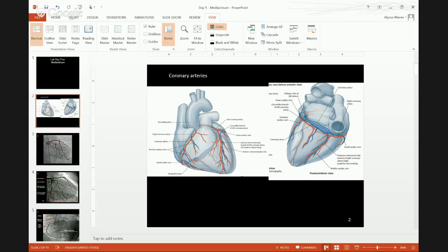So 2, we see the aorta, remember that comes off of the middle of the heart. So in 3, where we don't really see any aorta or any other vessels anymore, we're starting to see some sternal stuff here. We know that this is pretty anterior in the heart. Also, if you notice, the space of the ribs is getting smaller. So we're coming more anterior. Over here, the space in the ribs is quite large as we're moving forward. The space outlined by the ribs is getting smaller and smaller, and that makes sense.